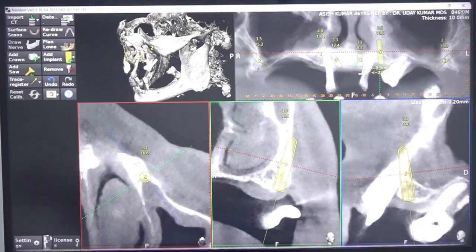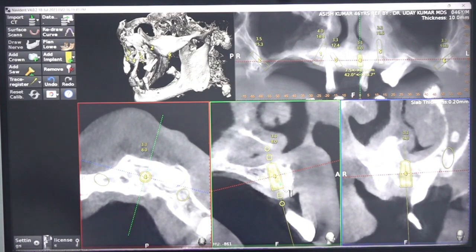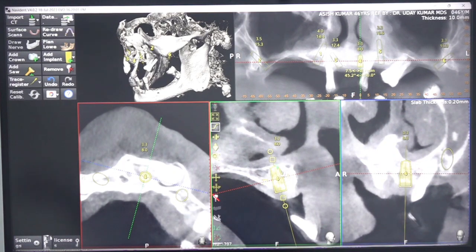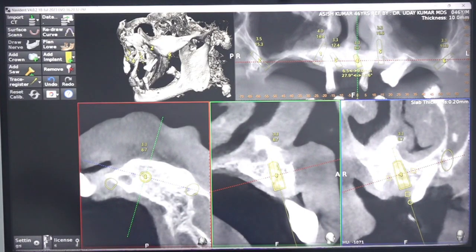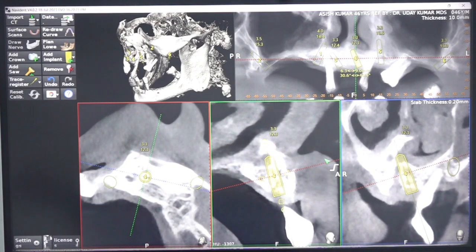Now we will come to the left axial. This is an 8 implant, short implant. 3.5 is better. 8, very minimal drilling. You will get maybe 30 Newton stability, but that is more than enough. We can do immediate loading also. If you are very much worried, then you can try delayed loading, but we will do immediate loading. This side you can tilt towards the midline. Actually you will get a 10 implant towards the nasal spine, 10 to 12 also. So this is one more option.